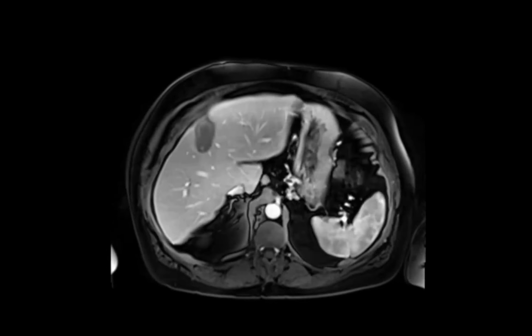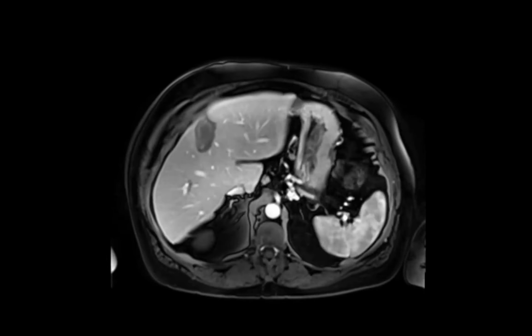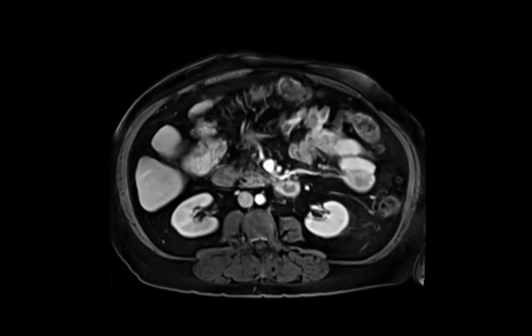Okay. This is a patient with a history of presumed HCC, pre-transplant evaluation, who had a prior ablation and is getting just surveillance screening. So that's the ablated cavity at the site of the prior hepatic lesion.